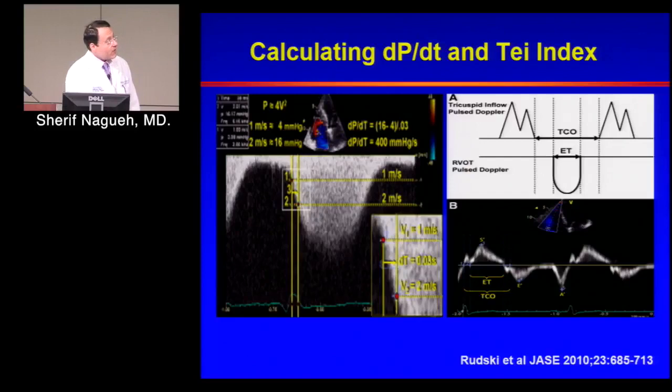You can look at the events during systole and during diastole with the same approach. If it takes a longer time in diastole, then it's a slower relaxation and it takes a longer time to decline. Where does this measurement cause errors?